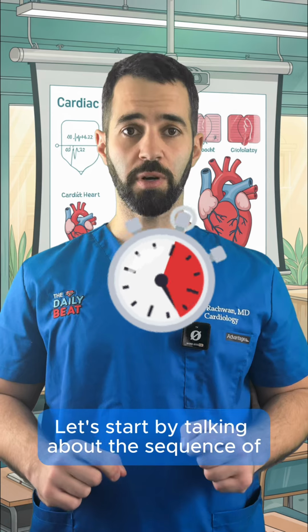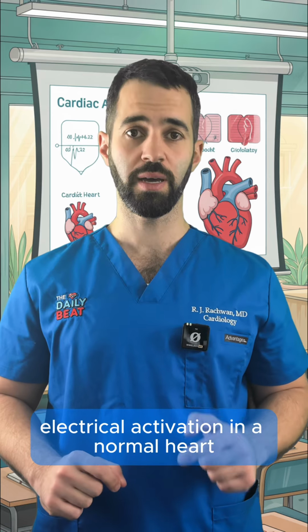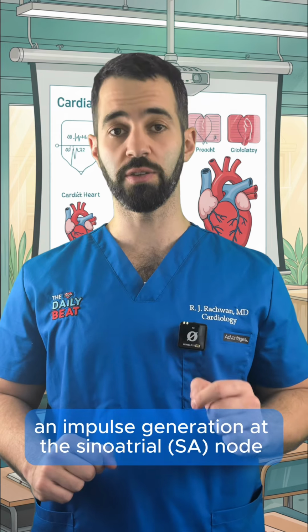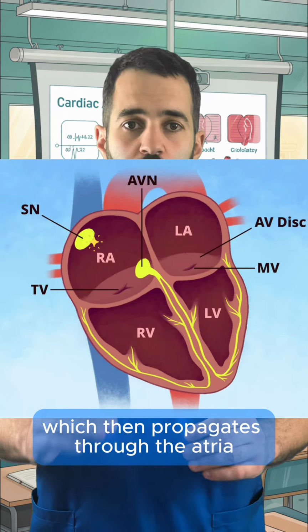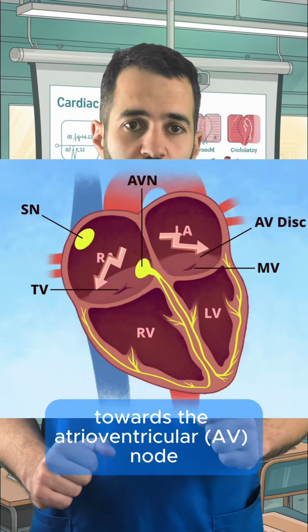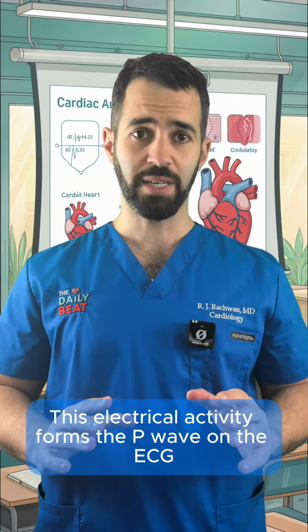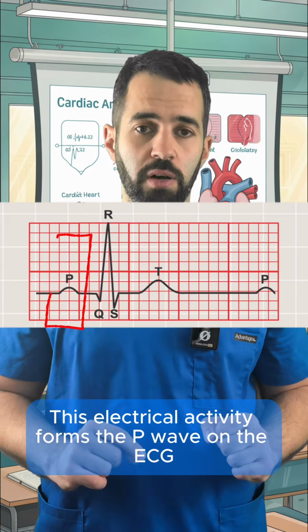Let's start by talking about the sequence of electrical activation in a normal heart. So the cardiac cycle begins with an impulse generation at the sinoatrial node, which then propagates through the atria towards the atrioventricular node, producing atrial depolarization or activation. This electrical activity forms the P wave on the ECG.